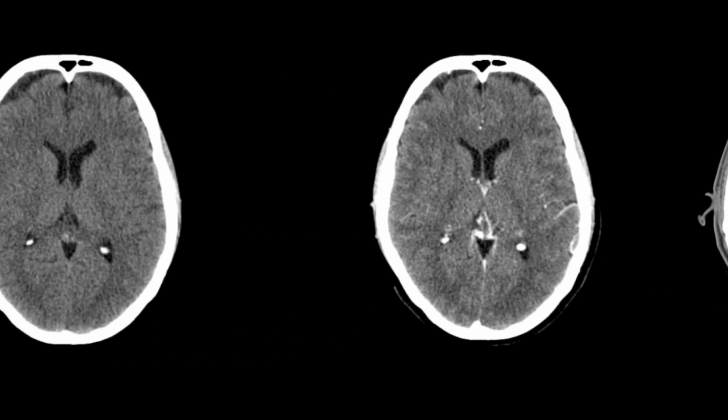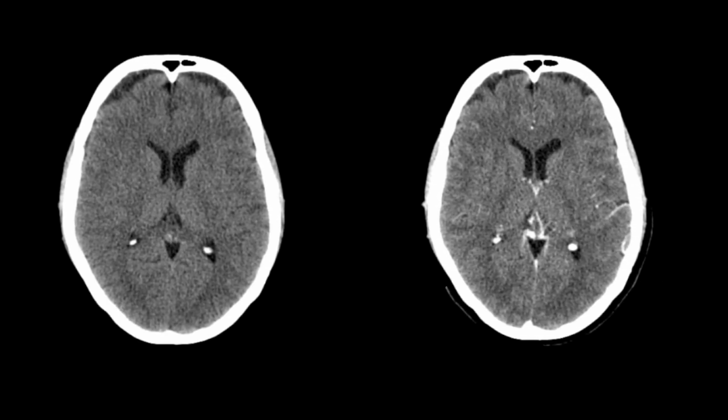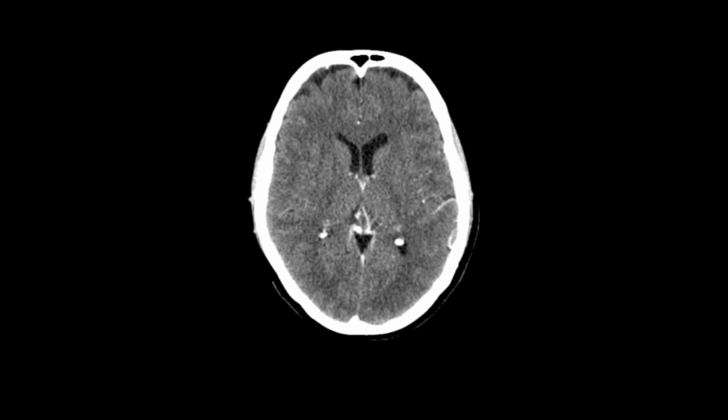Now, next step is identifying whether it's contrast enhanced or non-contrast or plain CT. For the sake of simplicity, whenever I say CT, I'm implying that it's a brain CT. This can be with any other CT, but let's just keep it at the brain CT. So take a moment to guess which one of these two is contrast enhanced. If you guess the one on the right, you are correct, and we're gonna discuss why it is contrast enhanced.